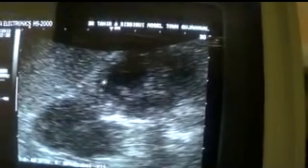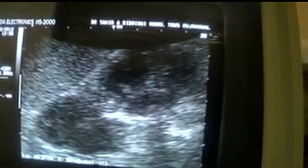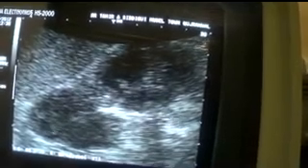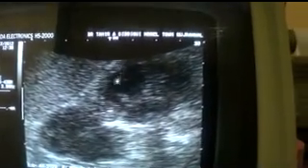So adrenal abscess gone, the differentials remaining are focal pyelonephritis with extension, and this is an extension from this focal lesion at the upper pole of the left kidney, and that's the reason it's sharing the capsule of the left kidney.